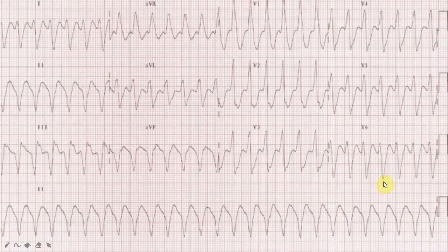In this particular ECG, the distance between the beginning of the R wave and the nadir of the S wave is 4 small squares, which is about 160 milliseconds. This is evident in V1 and V2 leads. Obviously, the Brugada sign is present. Therefore, the second step of the Brugada criteria is fulfilled. This is suggestive of ventricular tachycardia.